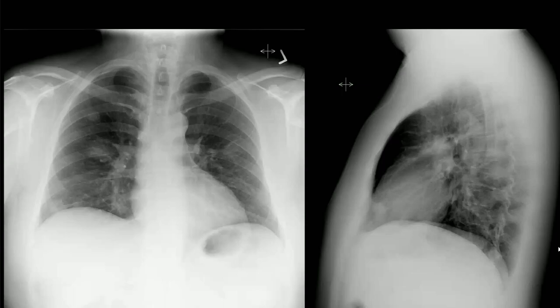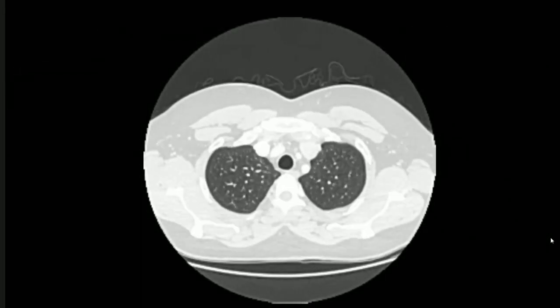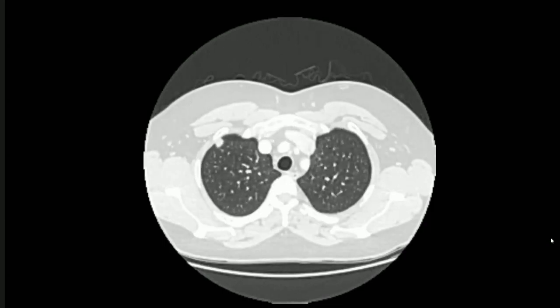You took the case very well. Honestly, the differentials would remain the same. It's very difficult to see the cavitation inside these lesions, but on the lateral radiograph, do you think there is some opacity inside the lesion? Yes, sir. There is some opacity, but I cannot appreciate any cavitation in it. Fair enough. That's a very good description. Just start your description for the CT scan as the images are going to come up.